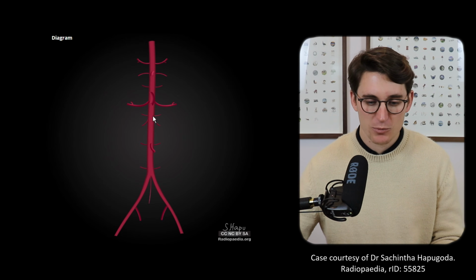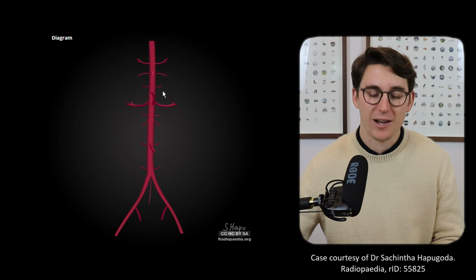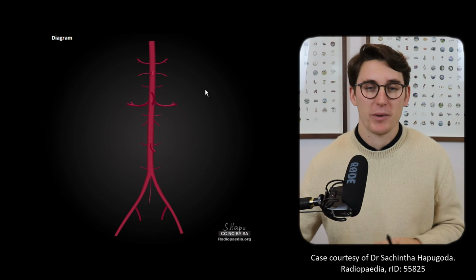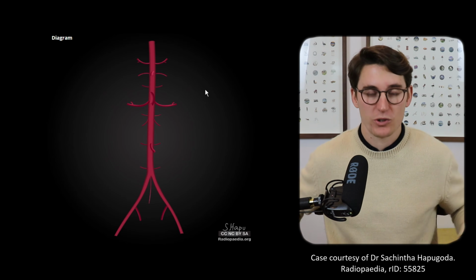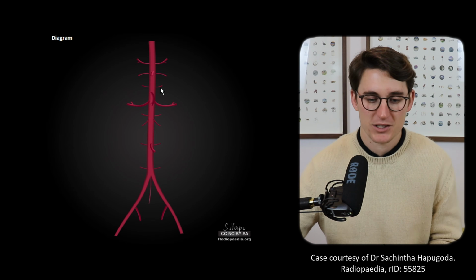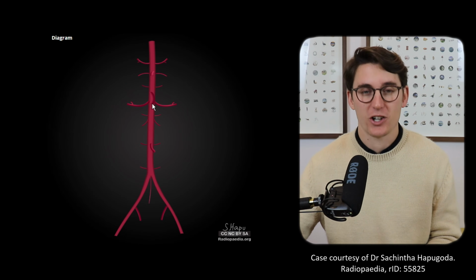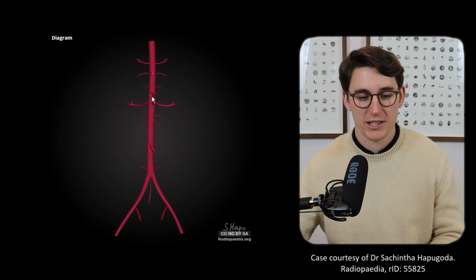And you may notice these small vessels coming back here. Those are our lumbar arteries from the posterior portion of the aorta, heading back towards the psoas and the quadratus muscles, as well as the vertebrae themselves. Then our next big branch is our superior mesenteric artery, and that's going to supply blood to our midgut.